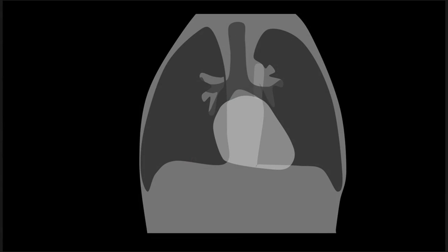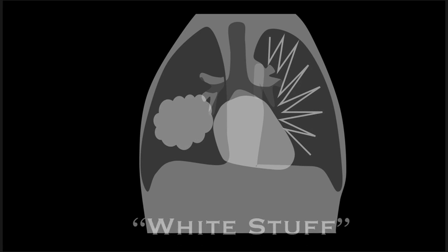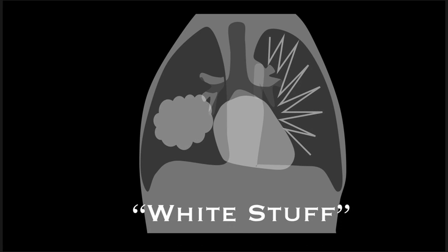In the prior lecture, I was trying to convey the idea that normal lungs on a chest X-ray should show nothing other than vessels and rarely a thin fissure. Other findings, various types of white stuff, have to be explained. We discussed that these come in two general categories: alveolar or airspace opacity, and then interstitial opacity. Again, we're going to be focusing primarily on the airspace opacities.